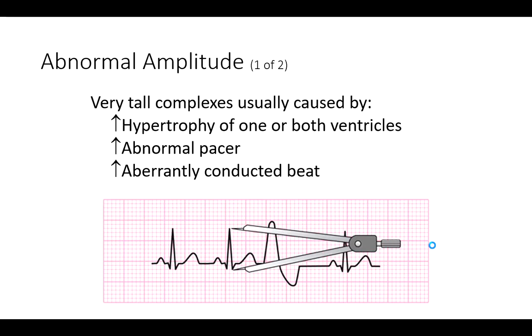How frequent is this occurring? I need to look at maybe a minute of time. Did I have a lot of these PVCs occur? More than 8? Less than 8? Did any of them occur in subsequent fashion? A run of 3 might indicate ventricular tachycardia. PVC, PVC, PVC, all in a row, right? This might give me a little bit more pause for concern than a random one that occurs every 20, 30, 40 seconds.